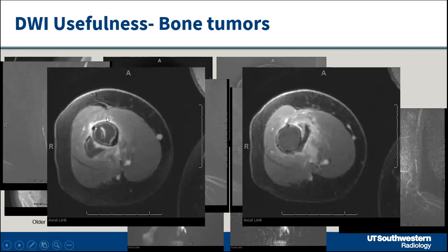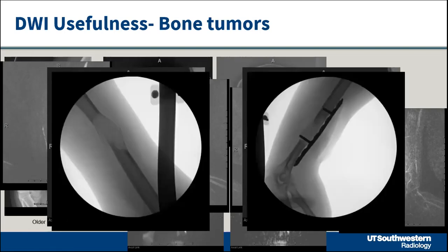And if you do contrast, there is peripheral enhancement. Now you can see the little fragment also there, which we didn't appreciate before. And that's another fragment. So this is just a simple bone cyst, but this was a 65-year-old patient. So all of this helps. And here this was fixed.